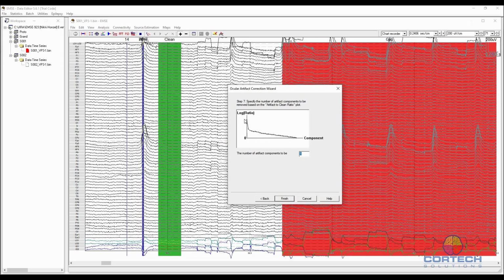Okay, so we have a clear discrimination. We have clearly one component and possibly another one. If we put a scree plot here, we have a sort of an imaginary straight line going like this. This one is clearly, we have one component that's popping out.